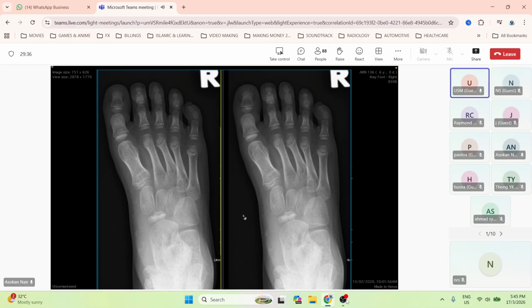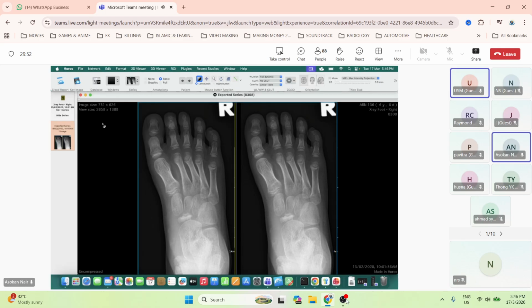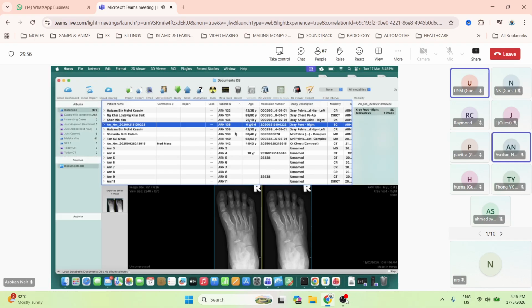Köhler disease, Prof. Yeah, okay, Köhler disease, okay? So again, for the exam, all the AVNs that occur in different bones, if there's a name to it, you have to know that and say this is what it is, okay? It's just a spot diagnosis, maybe a warm-up film, the first film or something, right?